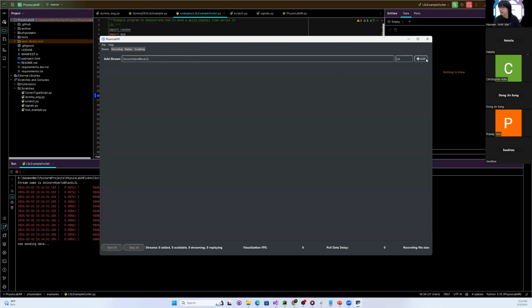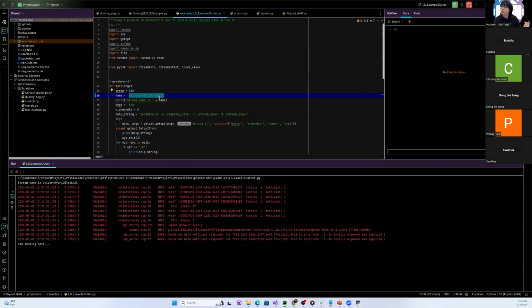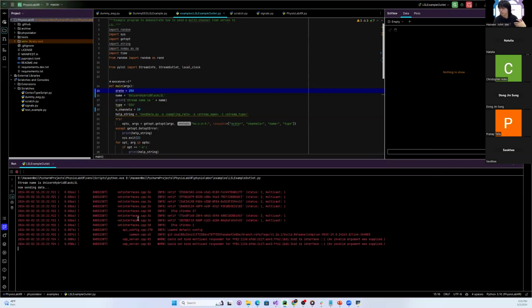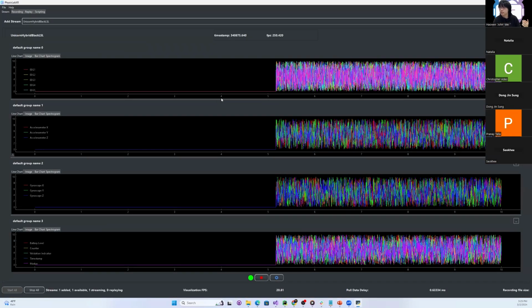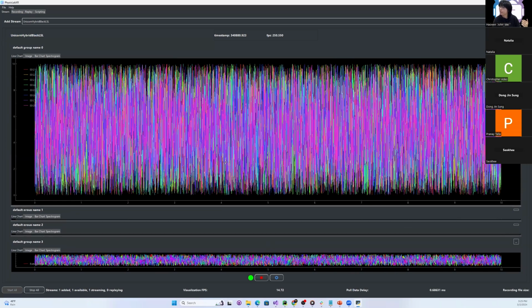Now, if I go back and add the stream here, for g.tec, let's have 19 channels right here, and change the sampling rate to 250. And we run the simulation again. So here we have the simulated EEG streams for the g.tec Unicorn device.